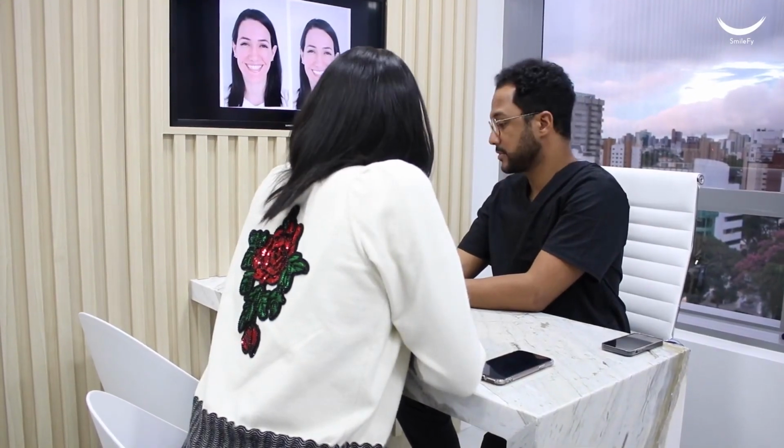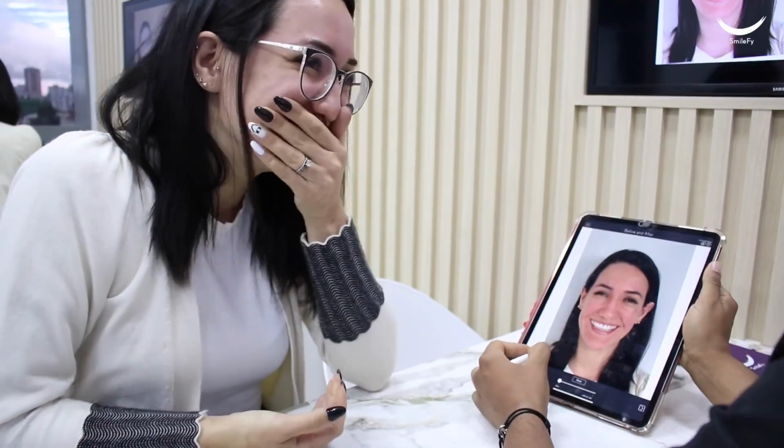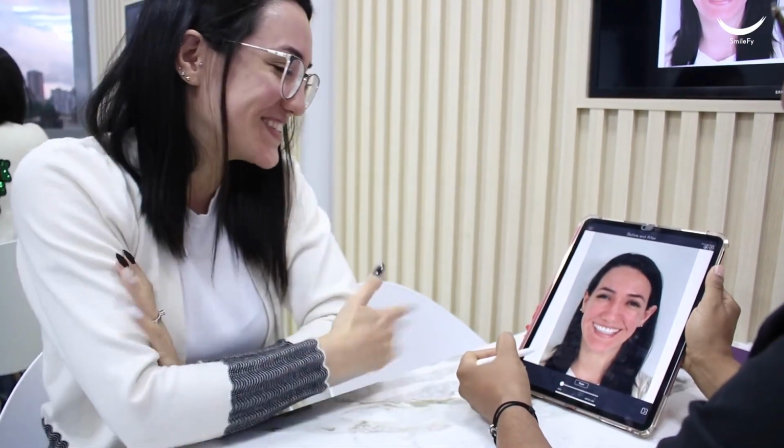It gives the patient a better understanding of what's being proposed, as now the patient can fully visualize themselves with the treatment that you are proposing. Of course, the smile simulation only simulates the patient's smile, so this is just a draft of the treatment plan. The next step is for you to start creating your own 3D mock-ups, where you can perform your smile trials or even temporaries or composite veneer guides for your final restoration.